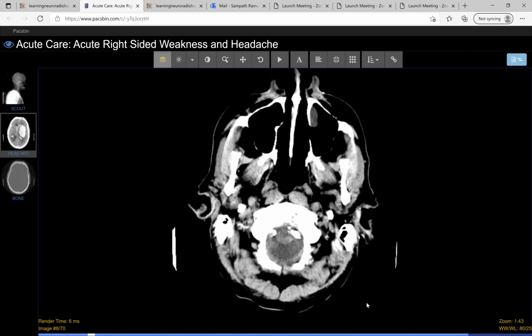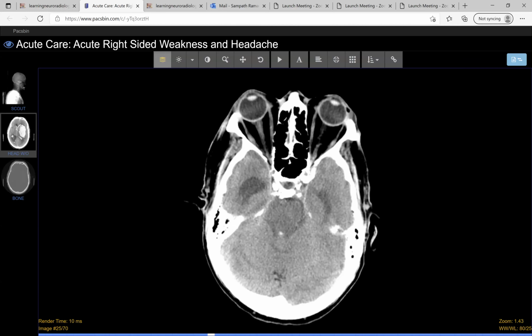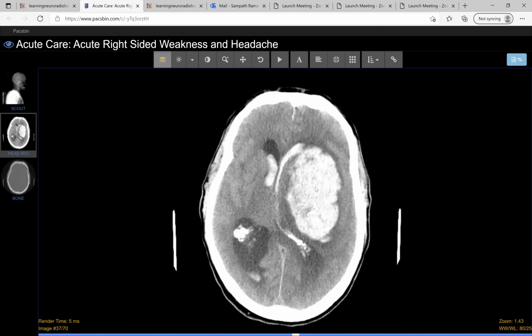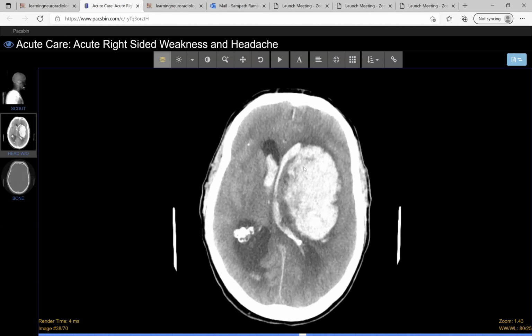Here we see in this patient the classic bleed. This guy has a massive parenchymal hemorrhage. So this is a huge bleed. As you can see, it's blood in his brain. This is all hyperdense. I spoke to you about that term briefly. So this is a classic of how a bleed looks in the acute phase. This is an acute hemorrhage that you can see.